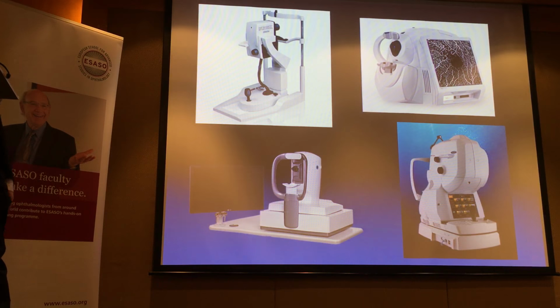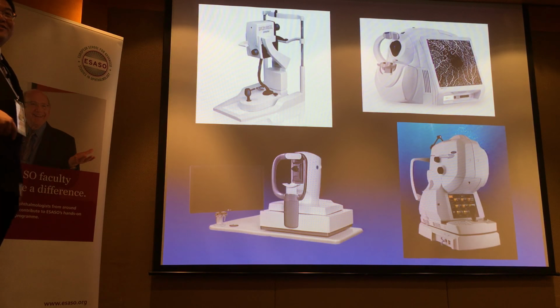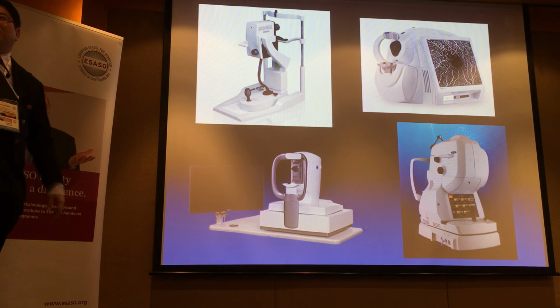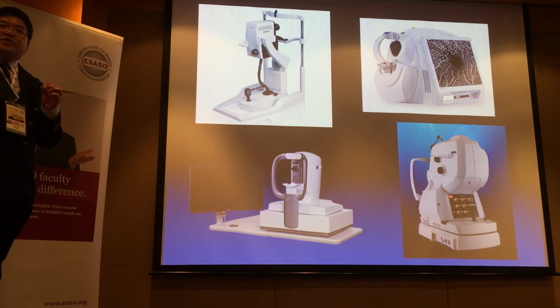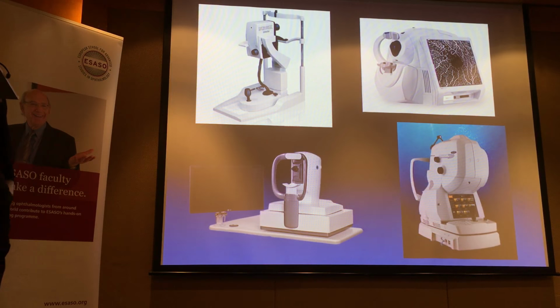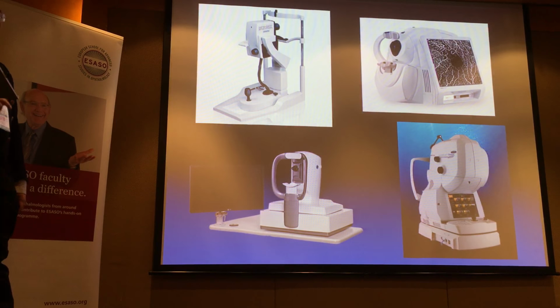So now I mentioned, of course, that there are different OCT devices, and there are even more brands. I just chose the more common ones that we hear about in use. I think what's important is, as I mentioned to you, the retinal thickness from each of these is different, because of the way they draw the segmentation lines. So it's inherently not comparable.